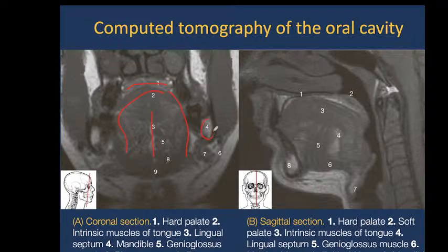the mandibular, two parts, left and right, the submandibular gland here, and even platysma. It is also visible. In sagittal section, there are hard and soft palates here, lingua as well, and some of muscles.